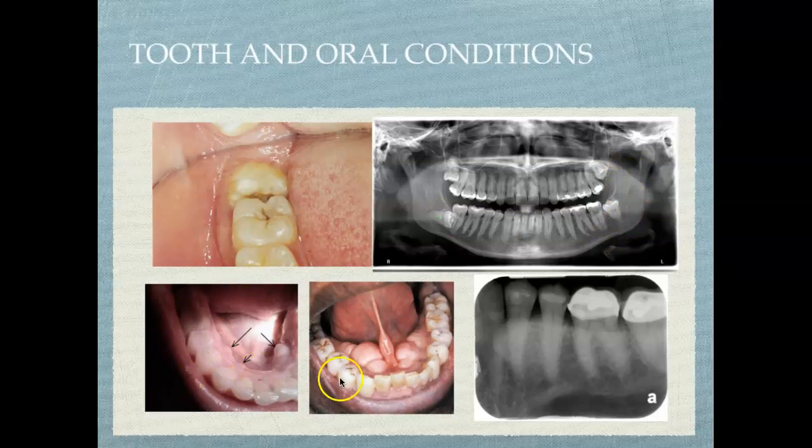Now we have a clinical view of our friend, the mandibular tori. I'm sorry, I'm joking.